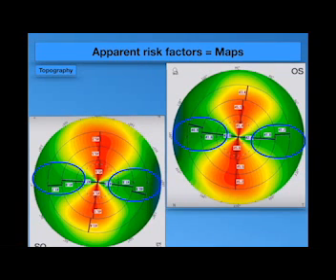So if you look at the maps shown in this slide, you will see that the vertical meridian is the steepest meridian, and the points pointed in red are from the superior part. The figures are 43 and the highest point. In the central 6 millimeter, you will find 45.1 in the superior point.